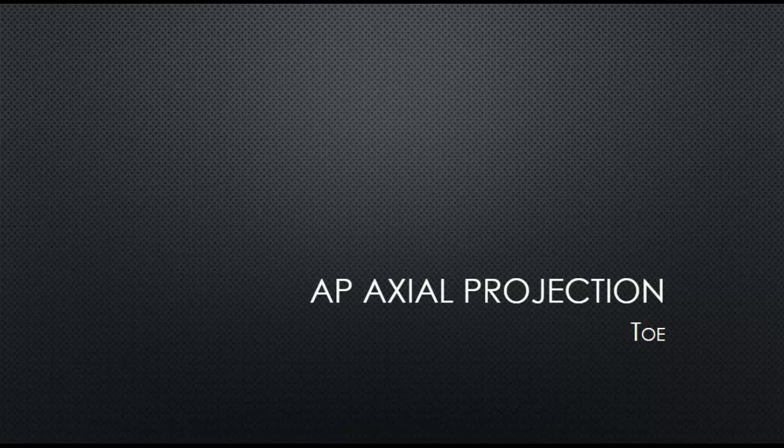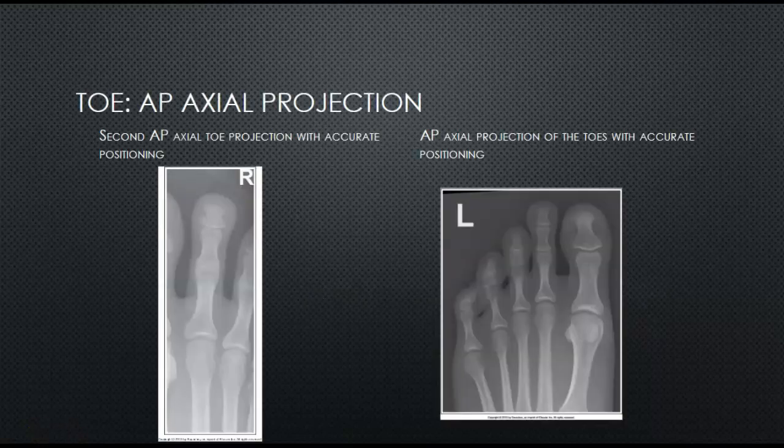Welcome to the image analysis on AP axial projection on toes. Image analysis guidelines on the AP axial projection of toes state that the mid-shaft concavity and soft tissue widths are equal on both sides of the phalanges.